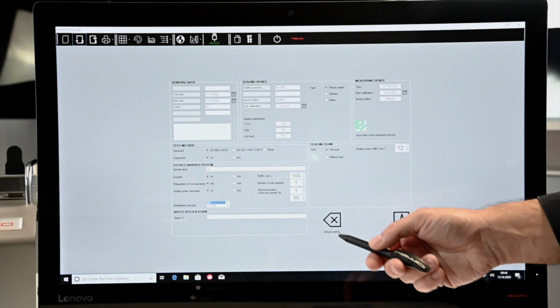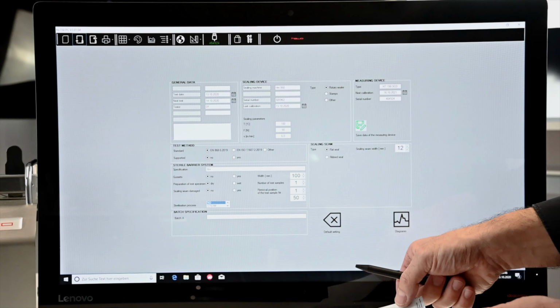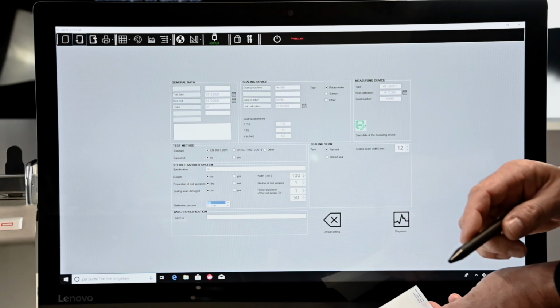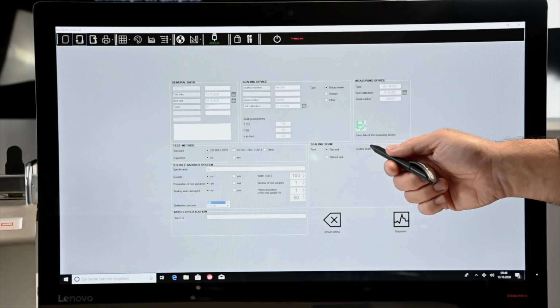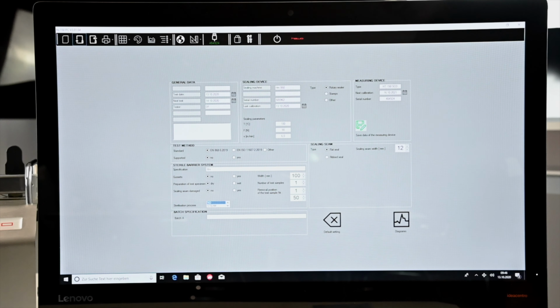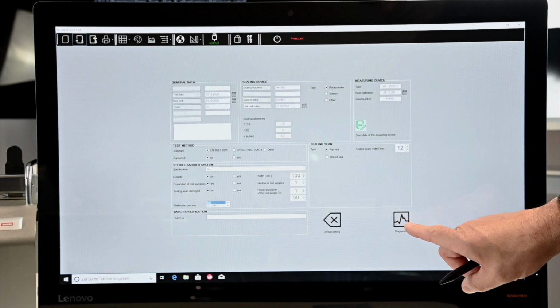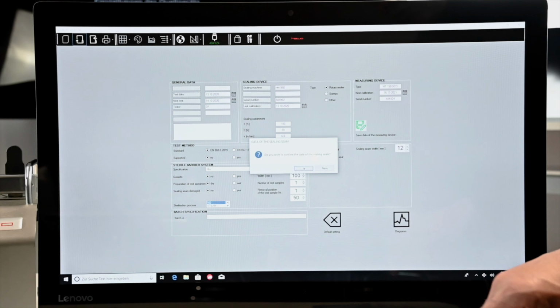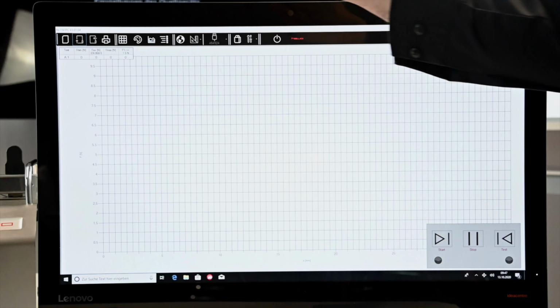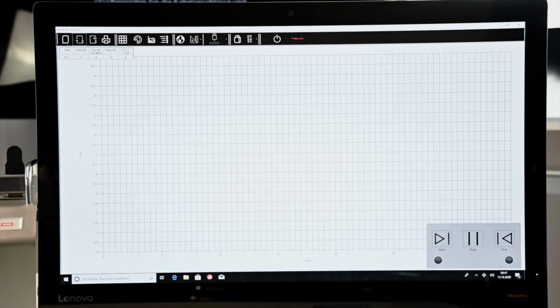Sealing seam specification is a flat hawo flex seal with a total width of 12 millimeters. Then please confirm all settings, and the device is now ready, prepared for testing and sample cutting.